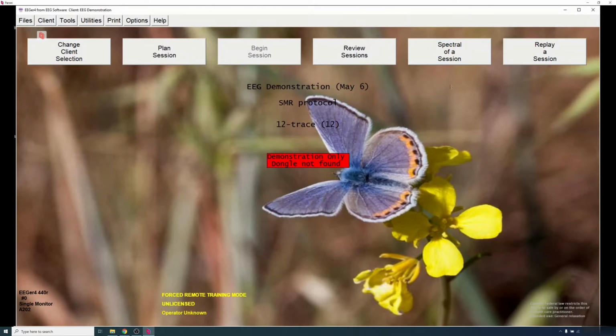Before running a session with Parsec, we encourage you to remotely connect with the home user to test the connection and make sure that actions happen in real time. If you have any problems or questions, this would be a good time to troubleshoot them using Parsec's help menu.